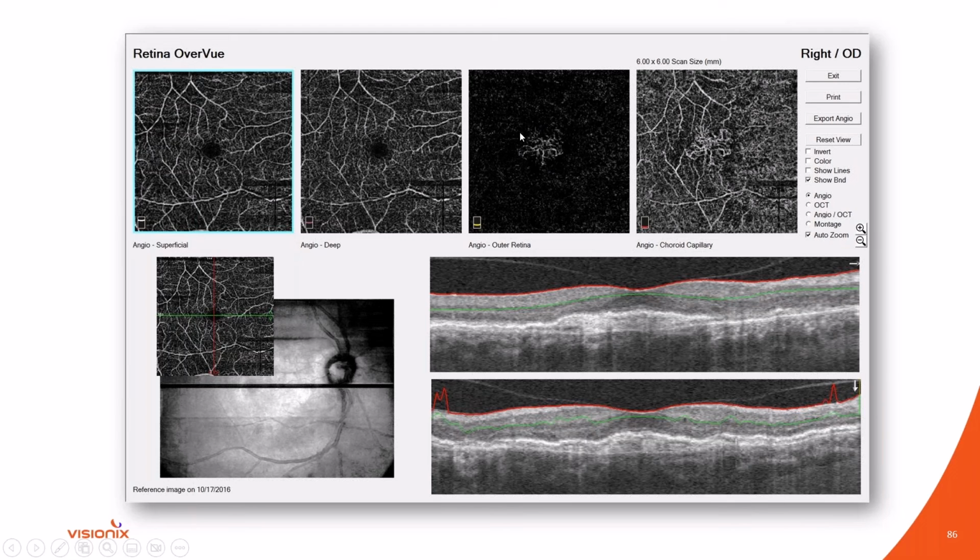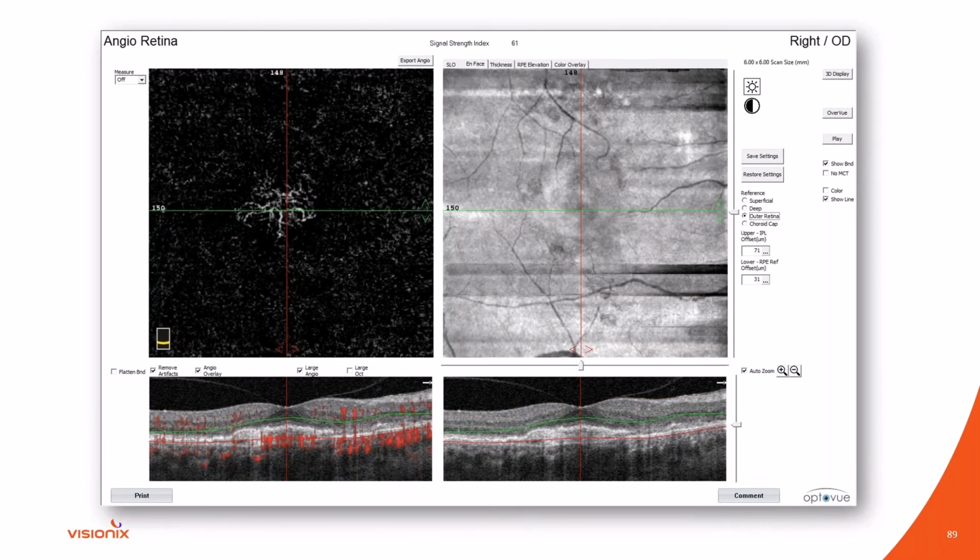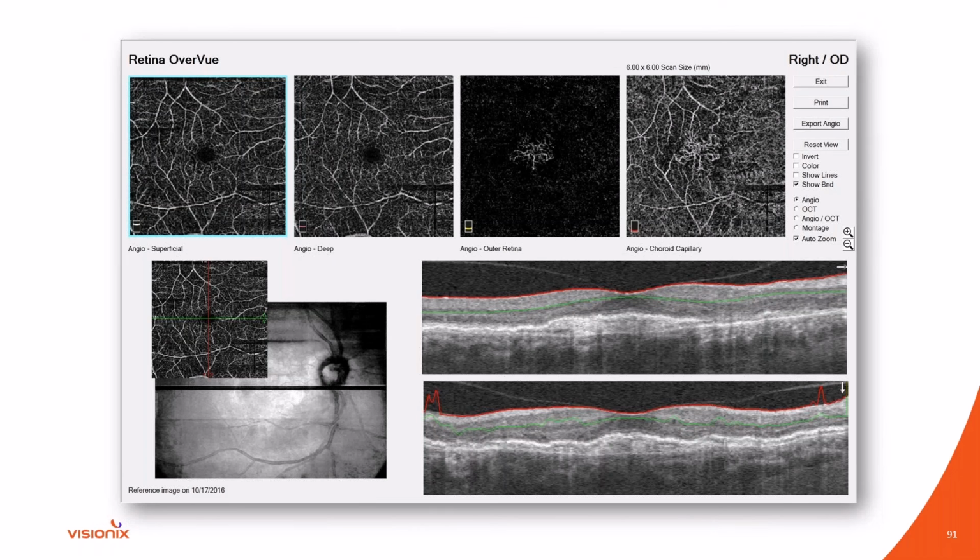Again, let's get this to the retina specialist sooner rather than later. So a third of you were slightly concerned and maybe observed this, and I think that's very reasonable based on OCT. Watch this closely. Maybe you're in a remote location. But at this point, you see this and go, man, we need to get to retina sooner rather than later to get this treated and the CNVM to hopefully go away very quickly. So there's our nice image of that CNVM in the outer retina right there.